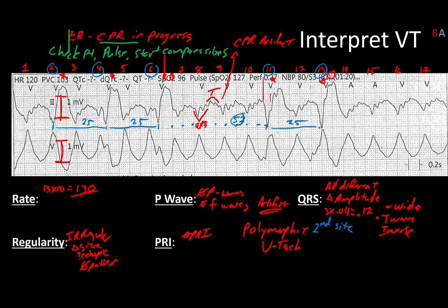That's really interesting, the fact that that can happen. Is it potentially something being driven by a P wave? Maybe the sinus node does fire and it just times out just right, so that you get a normal beat on top of a V-Tach beat? Potentially. A lot more detail would be needed to figure that out from here. But I just really wanted you guys to realize that things like this can happen. That may explain why you see patterns within patterns: lots of really cool stuff can happen.